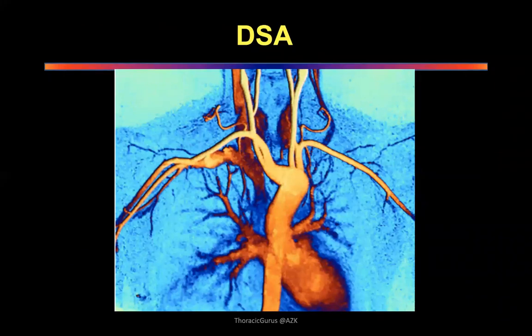One is superimposed on the other, and all the things which don't have contrast in them are cut away. So you do what is called a subtraction angiography, so that the blood vessels are highlighted. This is a computer software which does it for you. The protocol is different for different vessels, and then A minus B is equal to C, which is the image you're seeing in front of you.